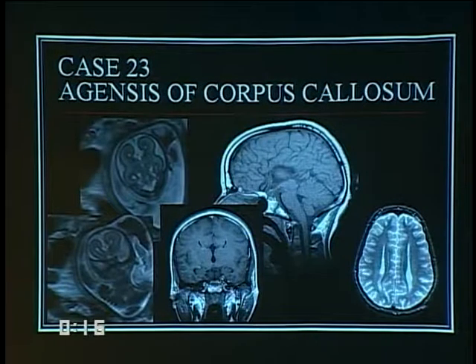These two patients do not have a normal corpus callosum. I showed you this image before just to reiterate the parallel configuration of the lateral ventricles, slight dilatation or colpocephaly, the occipital horns and atria, and those Probst bundles that sit along the roof of the lateral ventricles. They show you this kind of longhorn or steer horn configuration of the lateral ventricles, which you're kind of wondering if that's developing here, but you don't have that normal connection, that corpus callosal fibrous tract communicating between the cerebral hemispheres here.